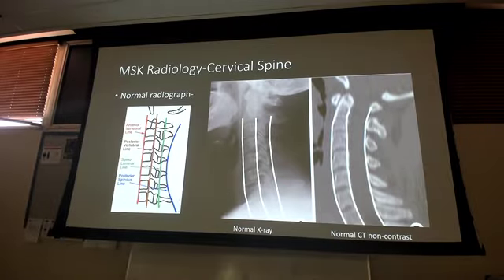Here's another one. Another one showing you that, and then I got a CT to show you how it correlates there. How do I know it's a CT? Well, I have a spinal column here, and I just got this gray, one-density thing. I can't make out spinal cord from CSF or anything like that. This is all just soft tissue and fluid in there. I know the spinal cord and the CSF is in there, but I can't tell the difference. So that's my CT. It just goes to show you those lines.